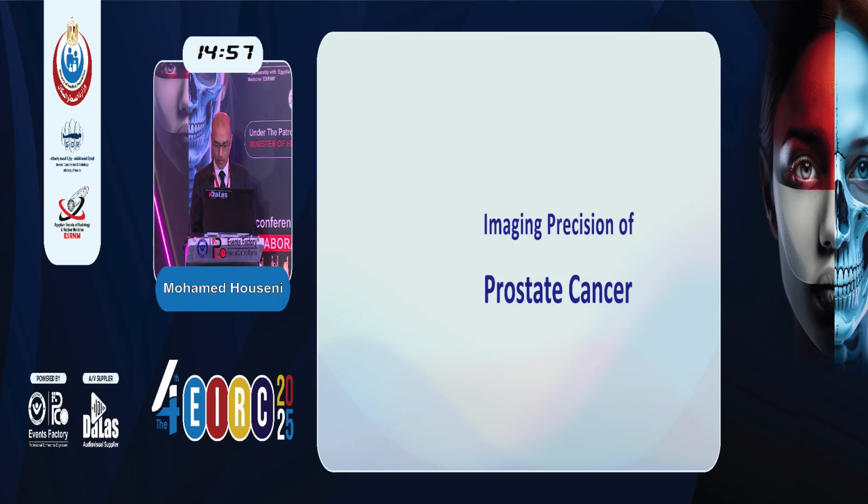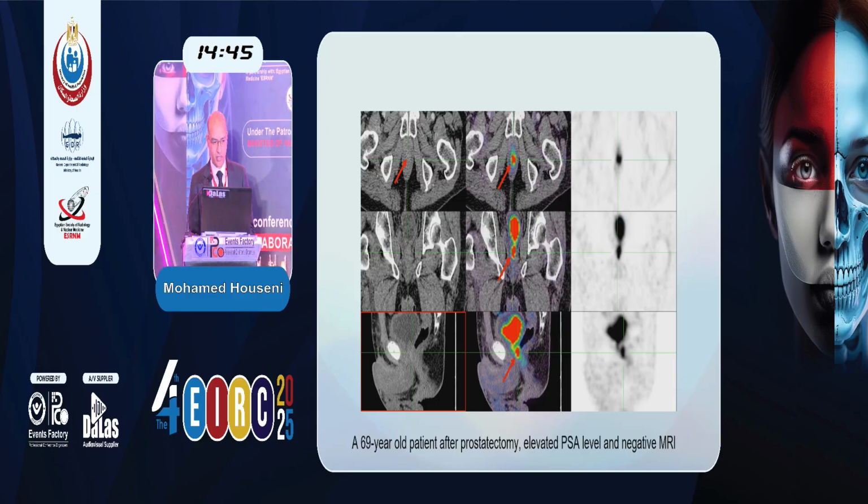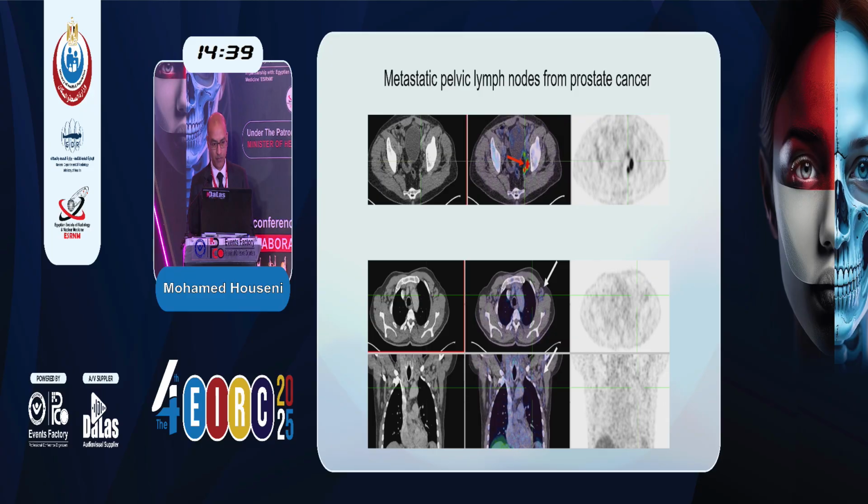Imaging precision for the prostate cancer. I would like to start with this case, a 69-year-old patient after prostatectomy and elevated PSA level with a negative MRI. The PSMA PET-CT demonstrated focal active lesions at the prostatectomy bed indicating recurrence.